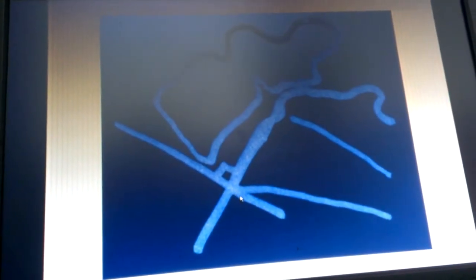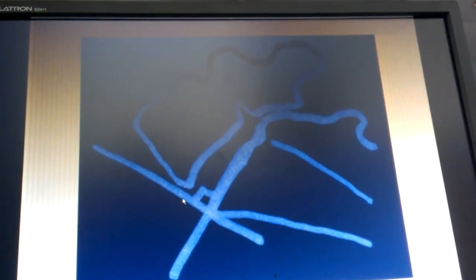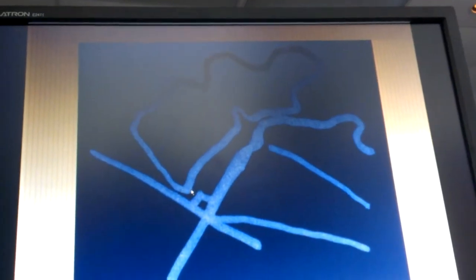All we do is draw a line along the sacral base, and then from the sacral promontory, we draw a perpendicular to that line. And now we're making reference to the anterior-inferior aspect of the vertebral body, trying to determine whether or not it's gone beyond that upright. And if it has, then probably you've got slippage of the vertebra.